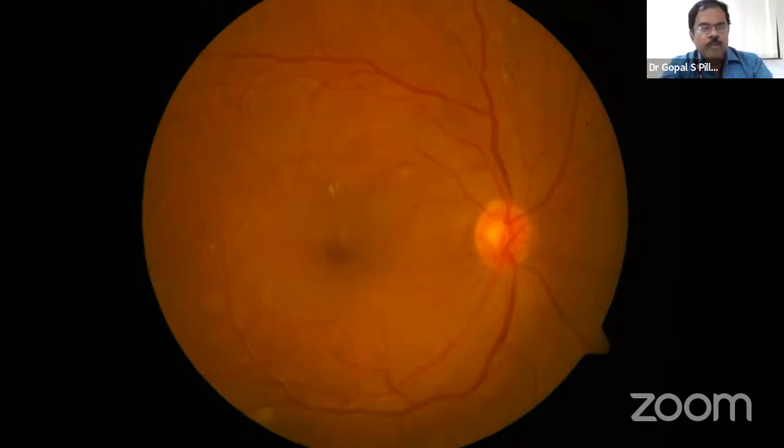And if you did not have microaneurysms which were leaking, but there was a lot of edema in those regions, and you could see that there is a lot of edema, those were the areas where we would put a modified grid laser. Not a total grid, but a modified grid laser, which are grade 2 burns, spaced 1 burn width apart, about 50 microns in size, maybe 20 to 25 burns you would put in the areas of edema, again beyond 500 microns of the center of the fovea. That was the treatment at that point of time.